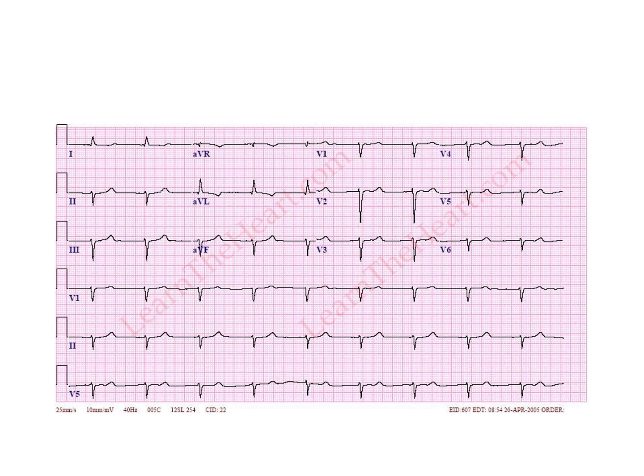They will usually be slow or slowish. The normal rate at which the AV node beats is somewhere between 40 and 60, but it is subject to the same speeding up or slowing down influences as the SA node. But the main distinction is going to be that there are either no P waves in front of the QRS, or the P wave is retrograde and it's buried somewhere in the ST segment.